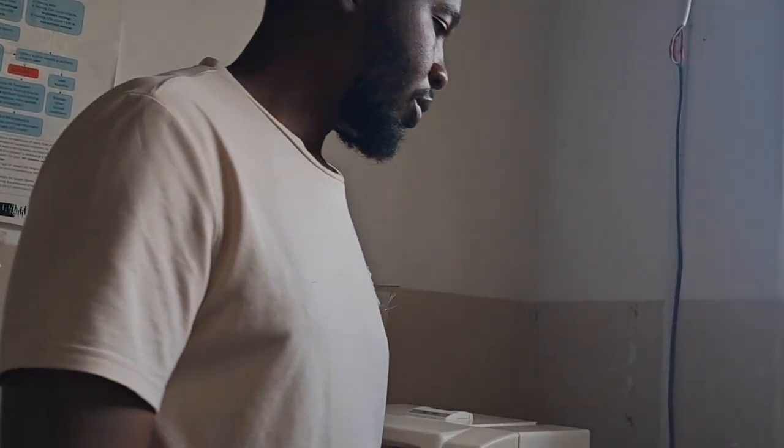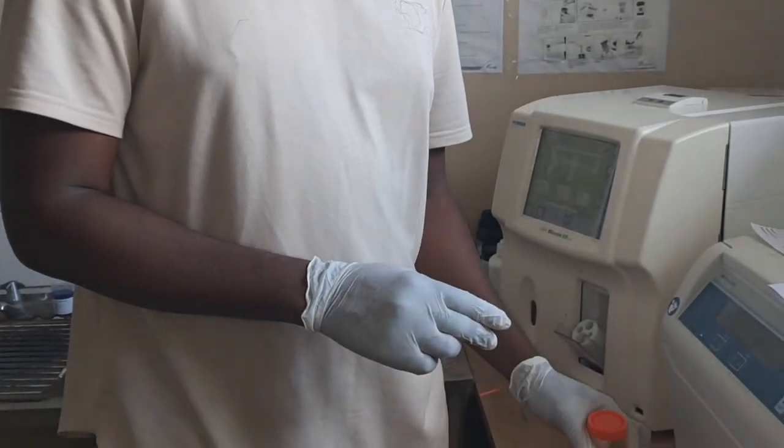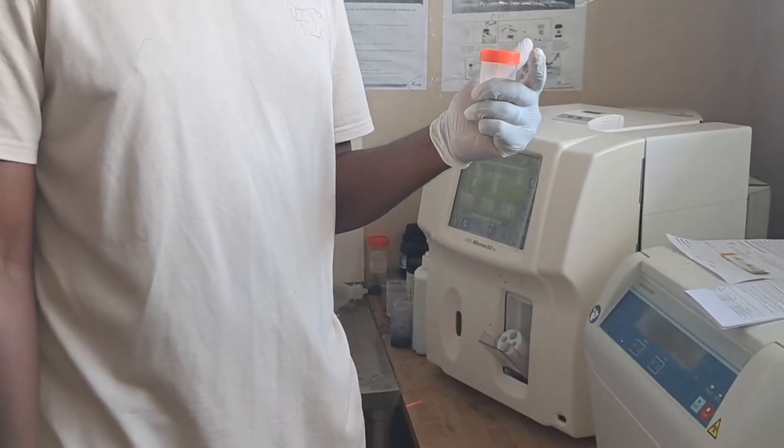Okay, so we are going to talk about specimen collection. For specimen collection, the most important thing that you need to have is the right specimen container, which is a plain urine container. We have a lot at the lab.